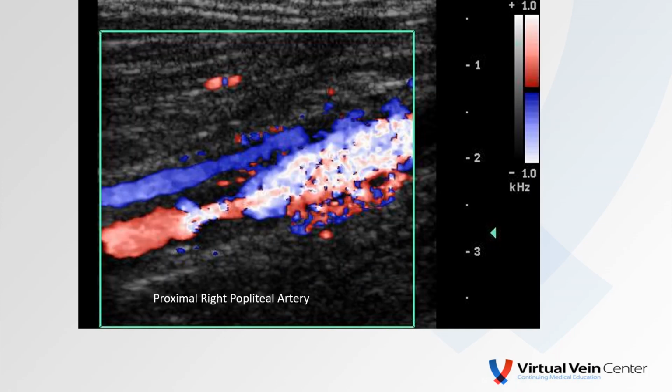Let's look at an example. Here's a nice popliteal artery stenosis. I've actually had this on my computer for many years. We can see disease in the image. We see a narrowing of the color flow channel. We see focal flow acceleration, disturbed flow distal to the stenosis.